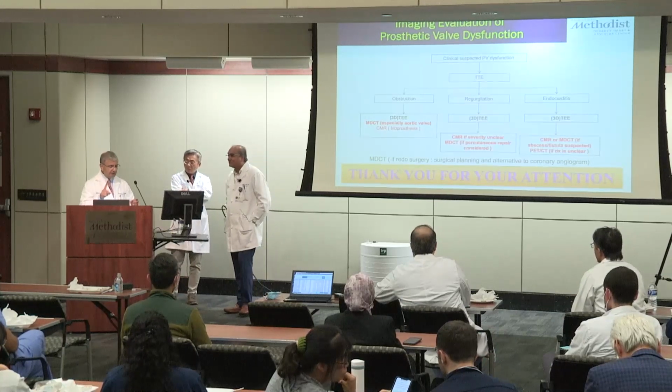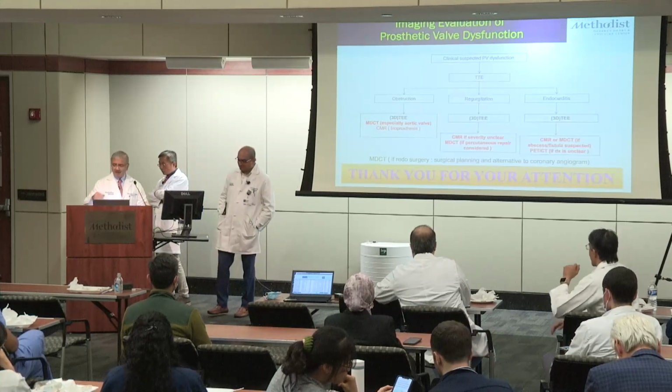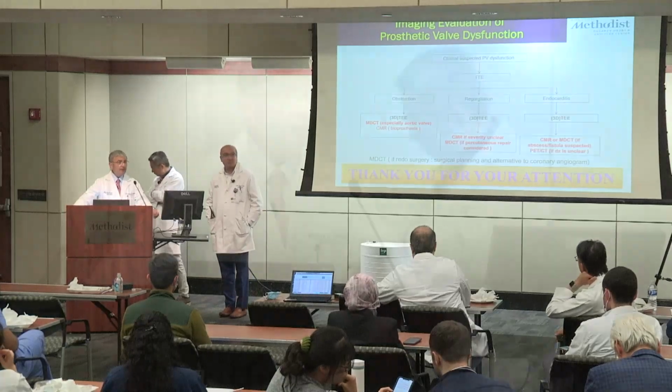I'm still not understanding, but I'll try. Is it the assessment of aortic regurgitation in a TAVI valve? The issues that you have in a TAVI valve: number one, the cage is long. So if I see a cage, I'm really not sure I'm at the leaflets, to find out whether it is intravalvular or extravalvular.